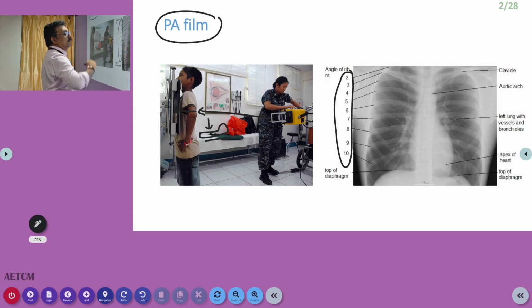Normally we see in a deeply inhaled X-ray that all these ribs are visible. Suppose you see a space, or there is a lesion in the bone, all those things we have to document. Fractures, malignancies, infiltrations, all these things you can see.